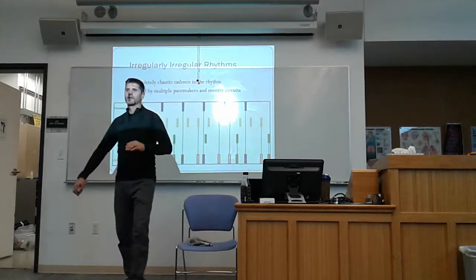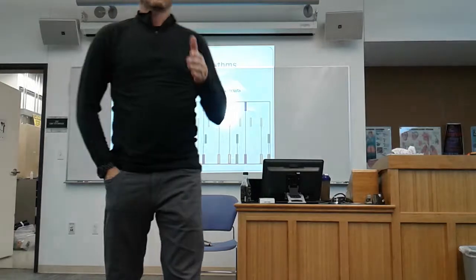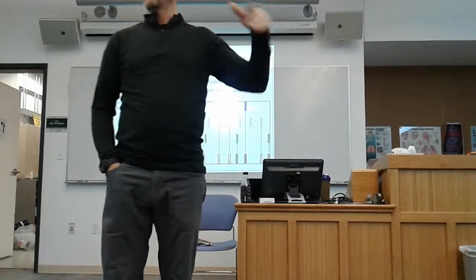So, if all of my P2Ps match all my RRs, and my calipers never have to change, I have a regular rhythm.